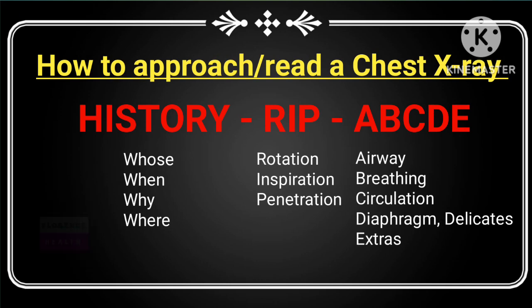Now let's discuss P, that is penetration or exposure. How do you know your X-ray plate is properly exposed or properly penetrated by the X-ray beam? In other words, you can say your X-ray plate is not overexposed and not underexposed.